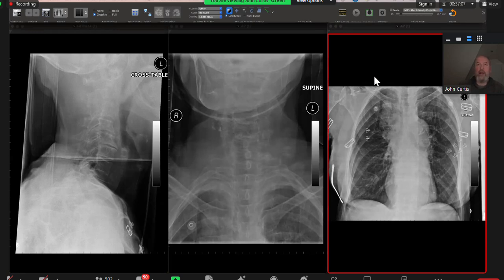Could it be a lung lesion invading the mediastinum? Yeah, the other differential, yes, it could be. However, I can see if the border is complete or not. If there is an incomplete border, it will be extrapulmonary. If it is complete, it could be a pulmonary lesion that's invading the mediastinum, couldn't it? Yes. And most likely it's going to be a bronchial carcinoma, which is what it was.